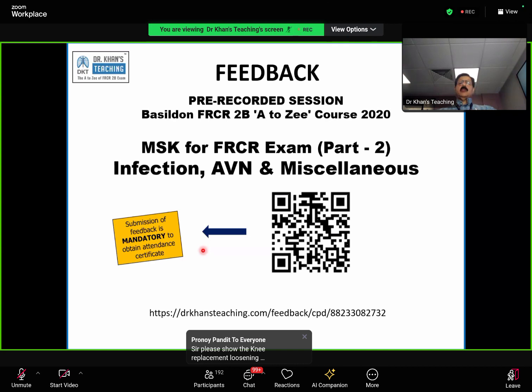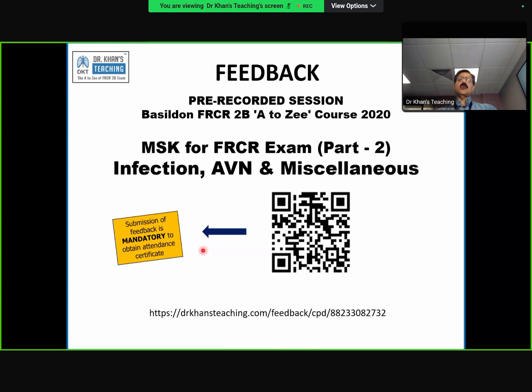Osteosarcoma, malignant Paget's, differential: the main point was that there was soft tissue ossification next to the lumbar vertebra, and that told us that there is something wrong, and there is malignant transformation, and this is an osteosarcoma.